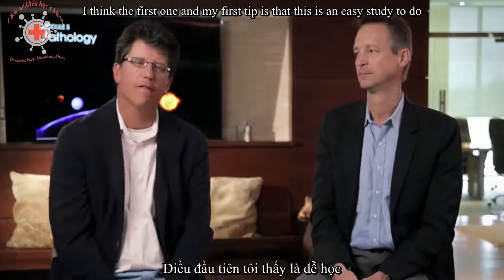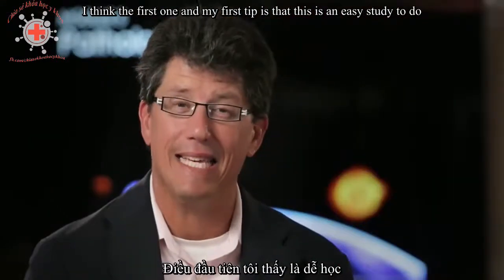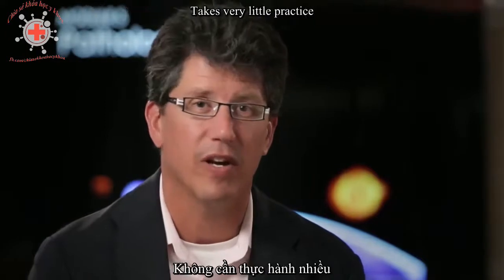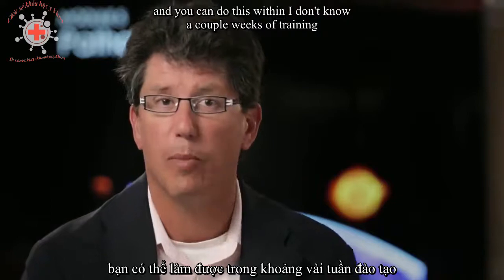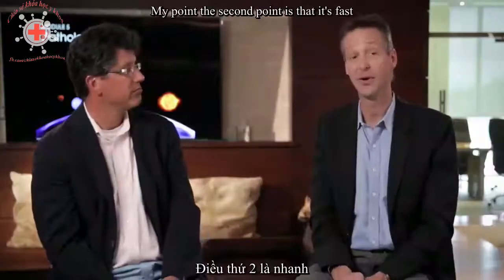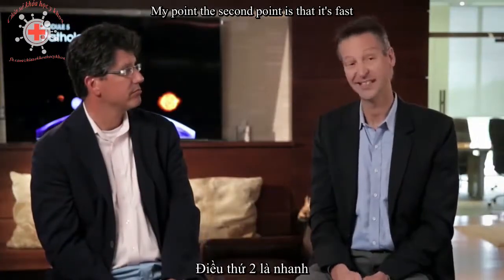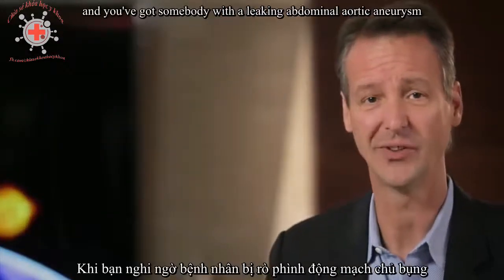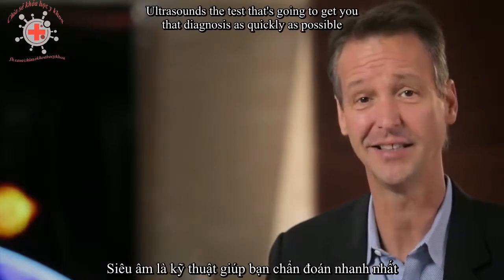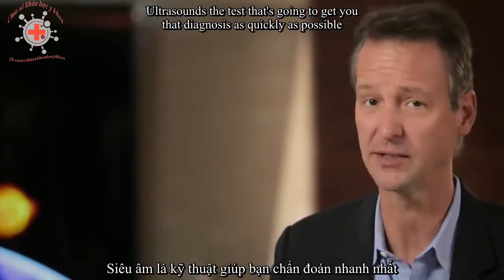Okay, so my first tip is that this is an easy study to do. It takes very little practice, and you can do this within a couple weeks of training. The second point is that it's fast. When time is of the essence, and you've got somebody with a leaking abdominal aortic aneurysm, ultrasound's the test that's going to get you that diagnosis as quickly as possible.